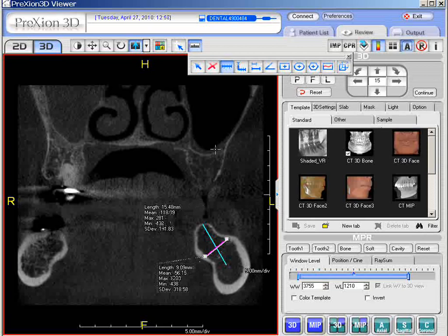To delete these, you can go over to, well, the quick way is if you right-click it and just hit delete, the numbers in the line will go away. The other method is if you come across to this red X as a delete, you can left-click it, drag down to the numbers, point the arrow anywhere in the number field, left-click, and it will be released.